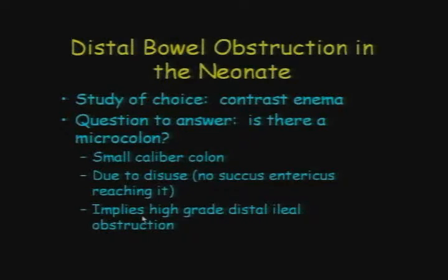And the question you're trying to answer is, is there a microcolon? If there is a microcolon, that colon is unused, the succus entericus has not made it there, and that will suggest that the obstruction is at the level of the ileum.